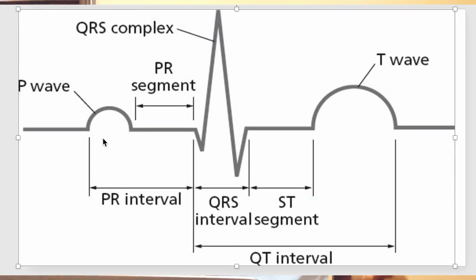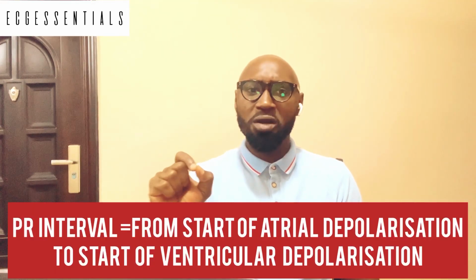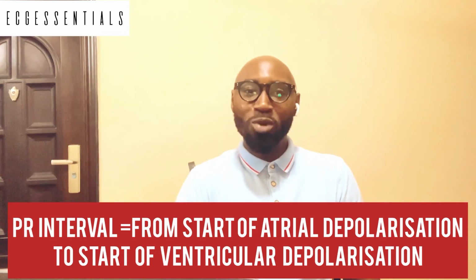With that understanding, we are able to speak of, say, the PR interval as shown on the image, which of course includes the P wave and the straight line that connects the P wave to the QRS complex. So in essence, the PR interval measures the time from the start of atrial depolarization to the start of ventricular depolarization.